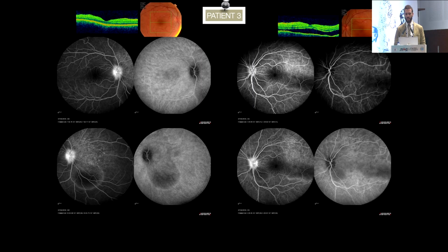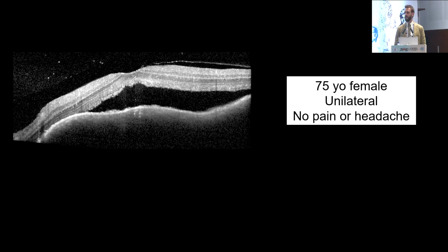Finally, this patient has a thin layer of subretinal fluid, and by performing our dye test, you can see that there is pinpoint leakage here on FA and hypo spots on ICG. So indeed, this is the case of VKH. What about this other eye?